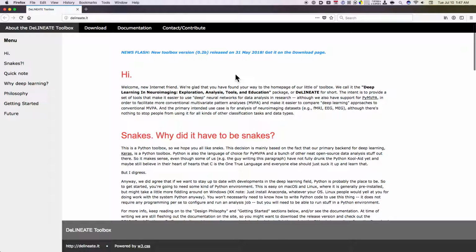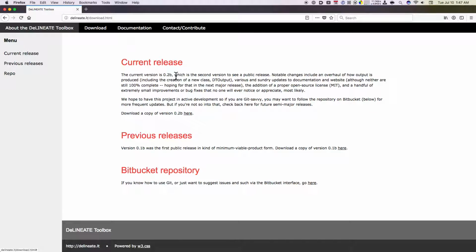Don't ask me exactly what it stands for because oh, there it is. The deep learning in neuroimaging, exploration, analysis tools, and education. So here's your education in this video. And technically, you don't have to use it for neuroimaging, but that's what we mostly use it for. So anyway, let me just give you a brief tour of how you might use this if you're getting started now.